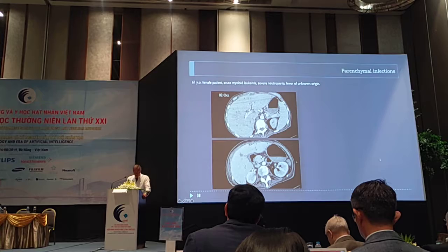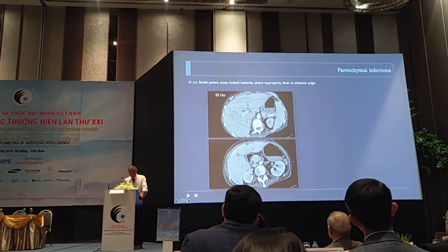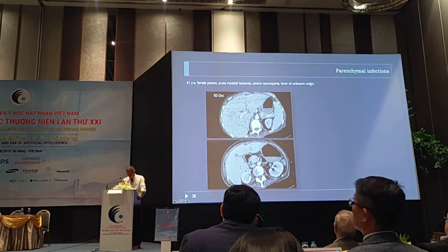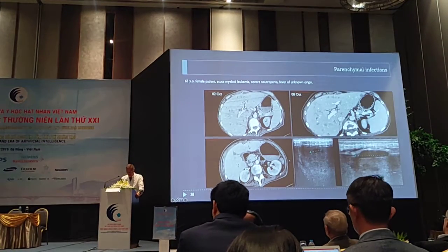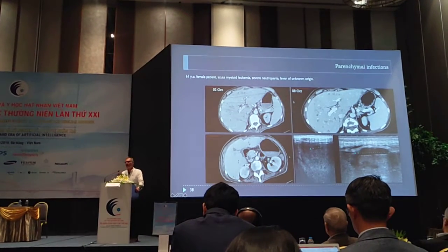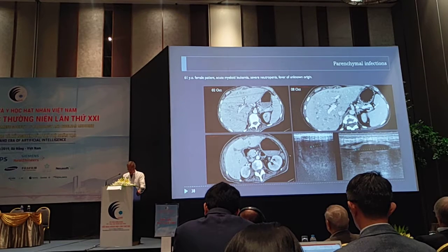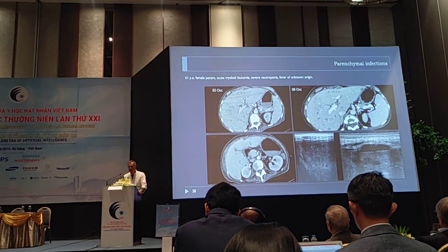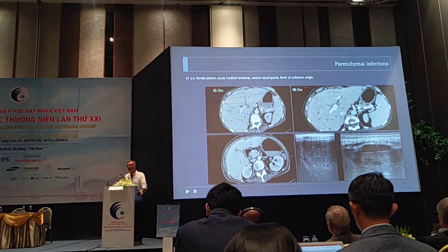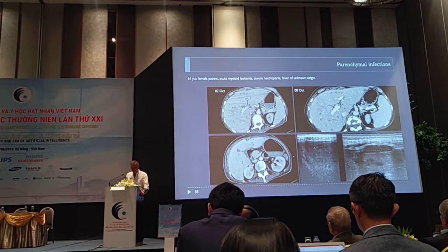And then, not nothing, but some microabscesses in the liver here and everywhere. Then we still waited, and these microabscesses increased in size and in number in the liver, so we clearly confirmed that these micronodules were not a solid manifestation of leukemia, but a manifestation of fungal infection.